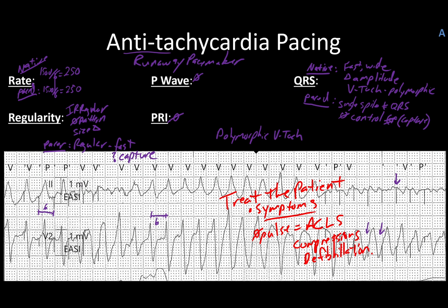Now, if this patient had an ICD, that would be really cool, because then it would do that defibrillation work for us and get them out of it. But obviously, by what you see on the screen, if it's there, it's not kicked in yet.